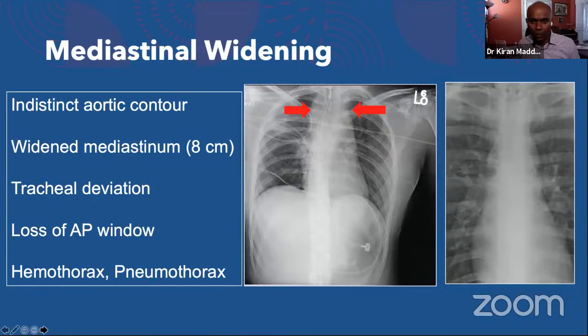It is mediastinal widening. So one is the mediastinum is widened, but if you look at the aorta, look at the images on the right. Somebody is chatting aortic. No, we are looking at... Abdul Latif, yeah, good answer. But mediastinal widening is different. Aortic aneurysm is different. Aneurysm has a contour. It will not cause a bilateral mediastinal widening, that too in a trauma. Aneurysm is less common, maybe a pseudoaneurysm you're talking about.